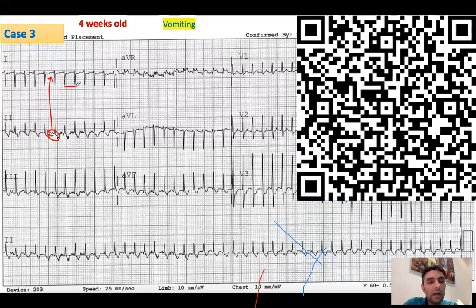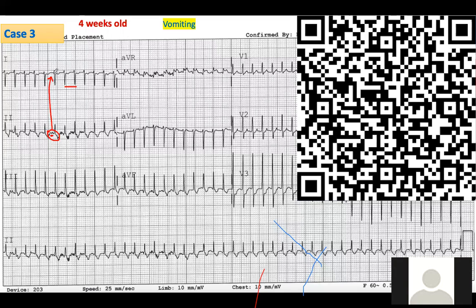Well, atrial tachycardia, I don't know whoever said that. Atrial tachycardia means there is an A, then QRS. A, then QRS. Again, where is your A? Look at the clean ECG, there is no A. Is this patient dextrocardia, Dr. Mohamed? Why do you say dextrocardia? The P wave is not clear in lead 1, but it is positive in aVR. Again, are you sure you're seeing P waves? That's the question.